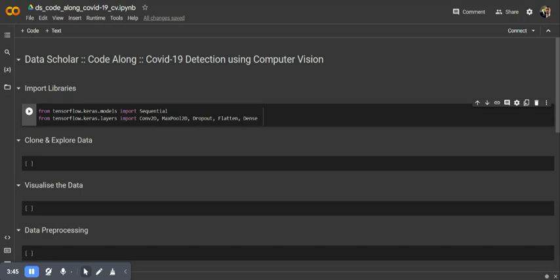And then we have the flatten layer. The flatten layer transforms a two-dimensional matrix of features into a vector, which can then be fed into the fully connected neural network classifier, which is what the dense layer is for. Flattening basically converts the data into a one-dimensional array, and then it can be passed over to that particular dense layer. The dense layer is basically the classic fully connected neural network layer where each input node is connected to each output node. We need a dense layer as they are used to predict the labels.